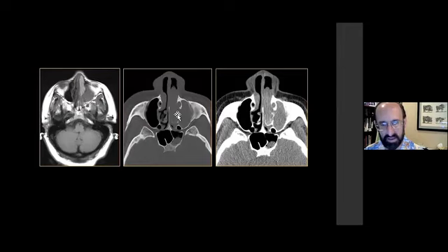Here was a CT scan on the same patient, so this was not subtle. This lesion was growing into the nares on the left side, and you can see on the CT scan no real hemorrhage. This was bright on T1 because of the melanin, not because of the hemorrhage. This was a CT taken the same day. And here's the obstructed secretions.